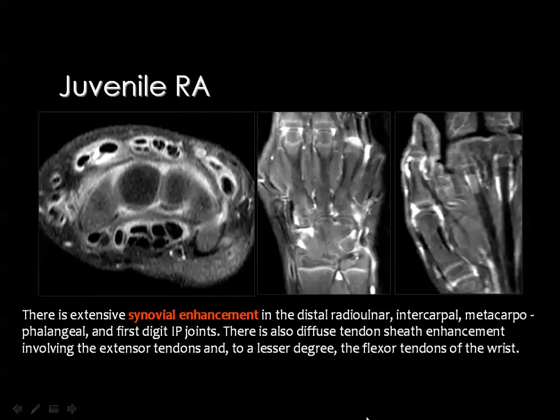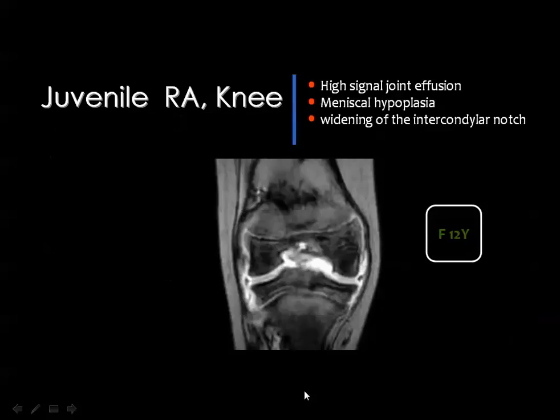Also, if you have the facilities to examine the patient by MRI, and you may inject the contrast media, then you can see the degree of synovial thickening, which is affecting the synovial sheath of the tendon, and also it can be seen around the carpal intercarpal joints, as well as in the distal radioulnar joint.